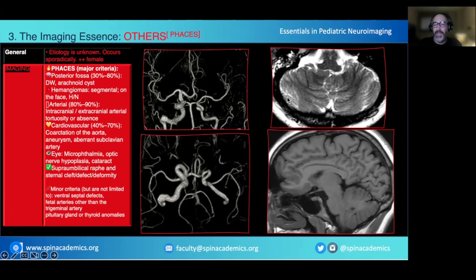They are not parallel to the calvaria. You have this type of foliation perpendicular to the others, and these paramedian hemispheres are dysmorphic relative to the other. And here you can see also a dysplastic frontal cortex with alterations of this gyral cortex, different from the other orientations of the rest of the cortex.